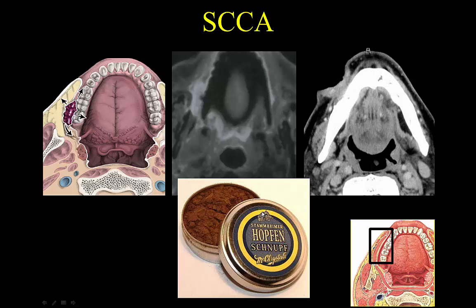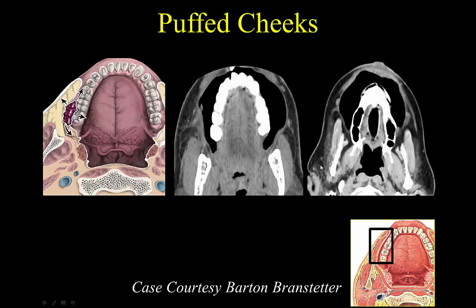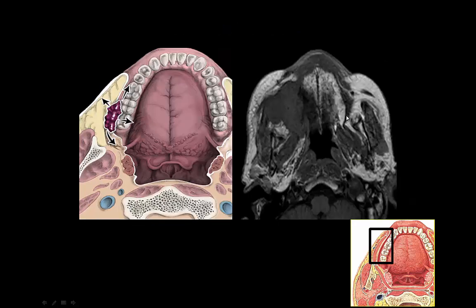So you put the little packets between your cheek and your gum and put you at higher risk. You can perform CTs with these, and we tend not to do things like the puffed cheeks. I think you potentially can see the lesions better, but really the physicians, the clinicians that I've worked with before, they can see the lesion well. What they're, again, looking for is the deep extent in the bone algorithm. So we tend not to do the puffed cheeks or other maneuvers such as this.